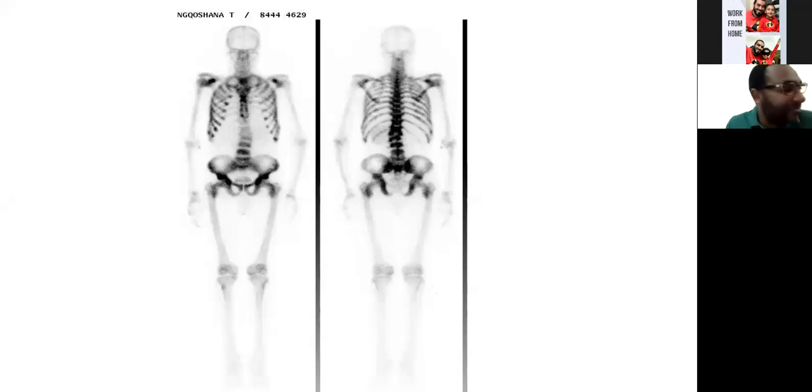So yes. This is a whole body bone scan for an adult patient. Beautiful. I cannot see the kidney outline, so it looks like a superscan to me. With multiple areas of uptake, I can see increased uptake in the posterior vertebra in L4. There are also areas of focal uptake in the ribs bilaterally. And also in the pelvic rim, there are areas of uptake. So given that the patient has a history of prostate cancer, I'd be concerned that it's a superscan secondary to prostate metastasis. Excellent. Thank you very much.